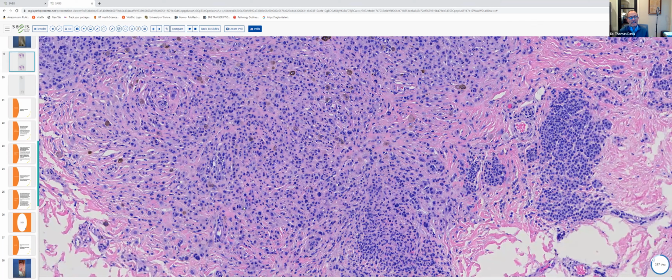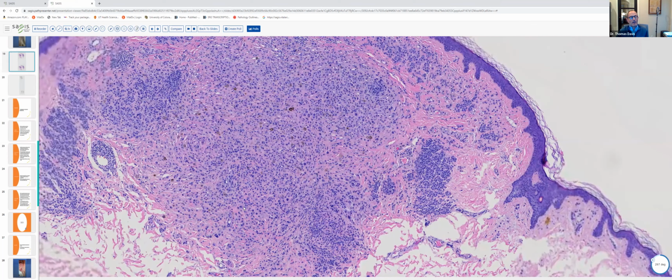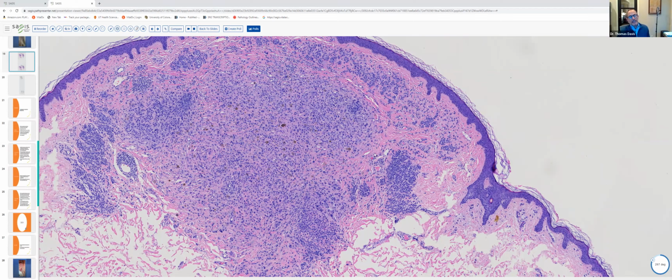Once again, a dual stain, Mart and Ki-67, looking at proliferation index and a melanocytic marker, revealed that this lesion was indeed melanocytic, all of the cells stained with Mart. It had a very low proliferation rate, and P16 staining was retained. Now, clearly, anytime we've got two distinct populations of melanocytes in a melanocytic lesion, we've got a combined nevus. We can call it combined when there are two distinct clones or distinct populations of melanocytes.